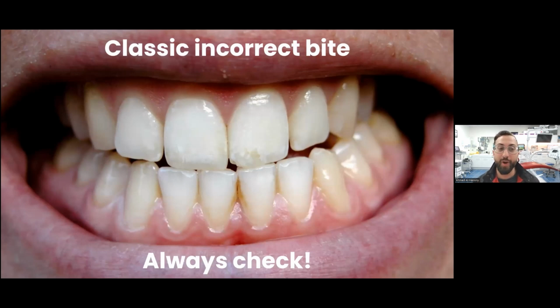And I know it goes without saying, but this happens to the best of us. I've made this mistake. Everyone's made this mistake. Just really carefully check how the patient is biting, because as we all know, when the patient is numb, they can bite in really weird ways. I'm sure as dentists, we've all experienced that. You tell the patient to bite down and they do weird things like protrude very far forward, etc.